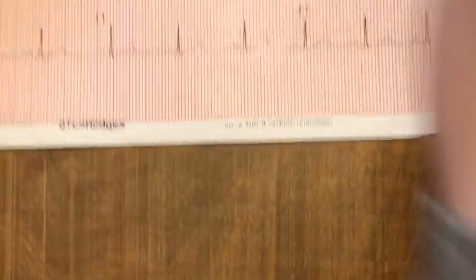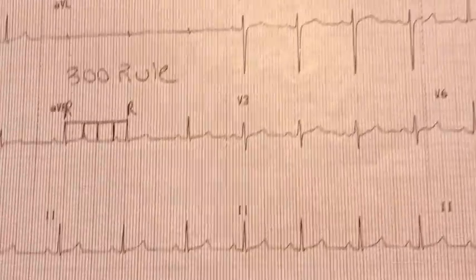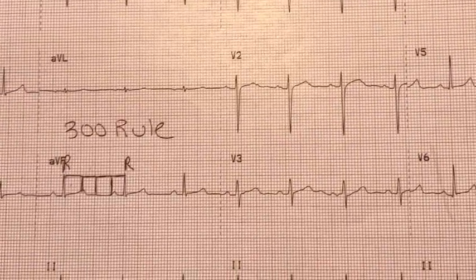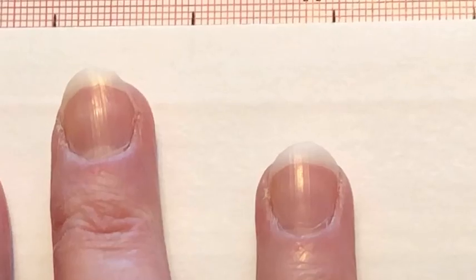The last thing I'm going to show you is a quick way to tell if your patient has a regular heart rate or an irregular heart rate. So you take an index card. I got an index card, and we're going to look at this wavelength down here. Kind of blow it up a little bit. I'm going to take my index card and put it up to the point where there are 2 R's. Remember, these are the R's.